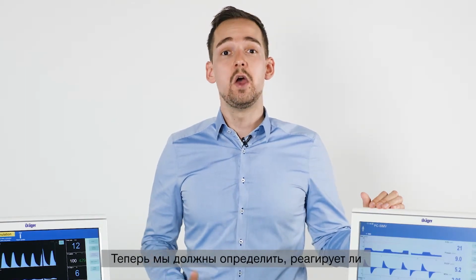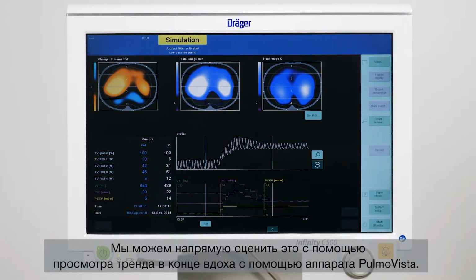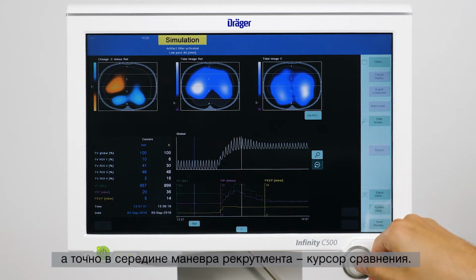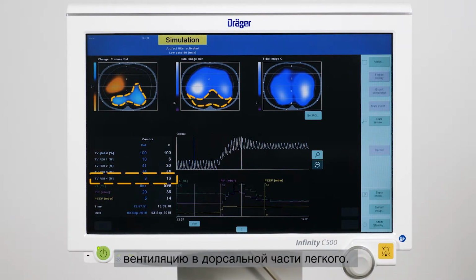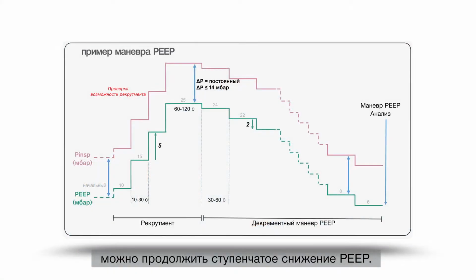Now we have to identify whether the patient is a responder or a non-responder to the recruitment maneuver. We can directly assess this with the help of the end inspiratory trend view of PulmoVista. I'm placing the reference cursor before the recruitment maneuver and the comparison cursor right in the middle of the recruitment maneuver. We can see a tidal image for each cursor position. In this example, the recruitment maneuver was able to significantly improve ventilation in the dorsal part of the lung.